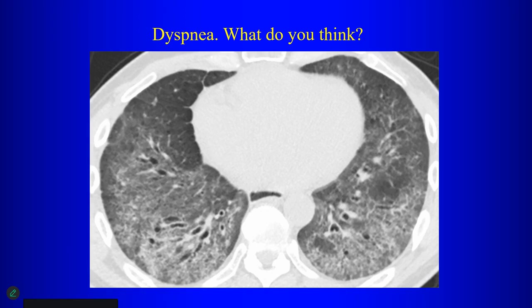Does this patient have fibrotic lung disease? Or is this ground glass pulmonary edema? Or is this ground glass infection? Or is this a fibrotic lung disease? There's bronchiectasis. It looks like maybe some pleural sparing. So what kind of bronchiectasis is that? Traction bronchiectasis, right? That's important. Traction bronchiectasis tells us that there is fibrotic lung disease, okay?